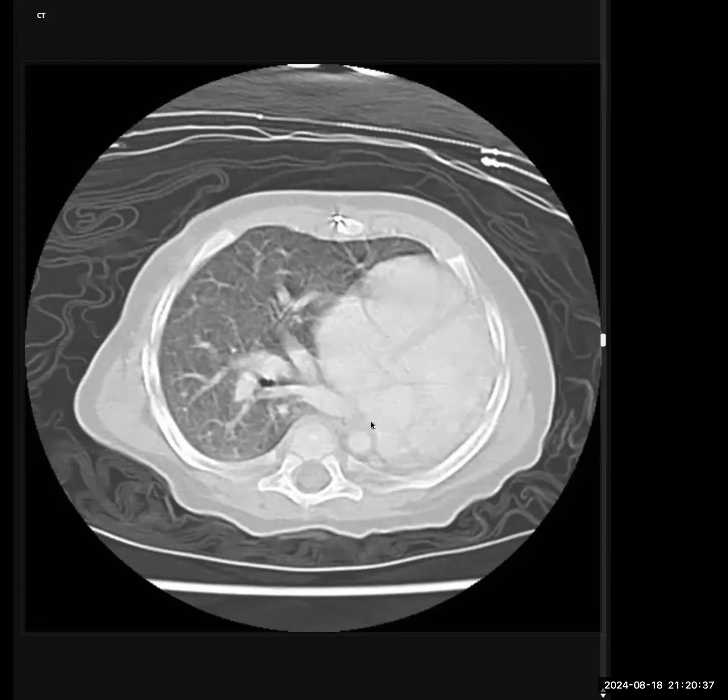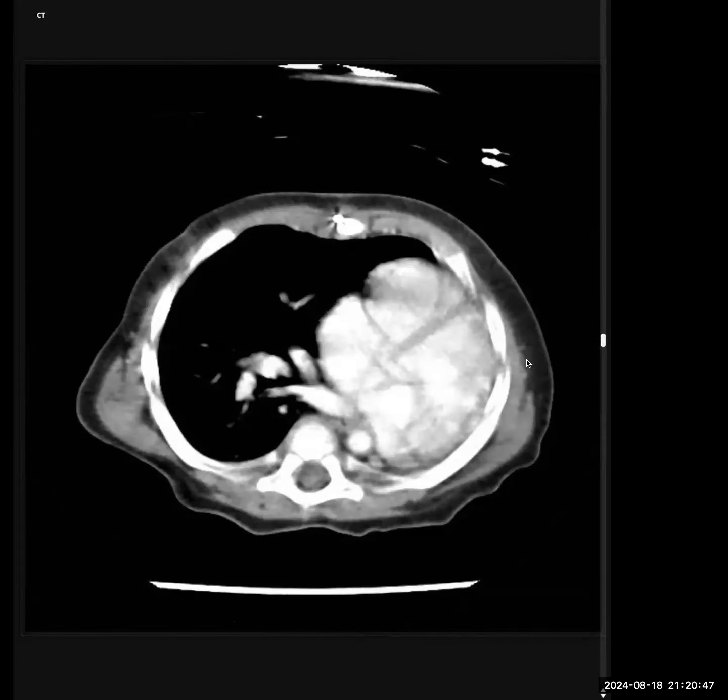Here you go. Ask for control. You wanted the CT chest? Okay, so I just let go of the mouse. Sure. I will give you control. Which window would you like? Soft tissue window first and then lung window. Okay. You have control, yeah.